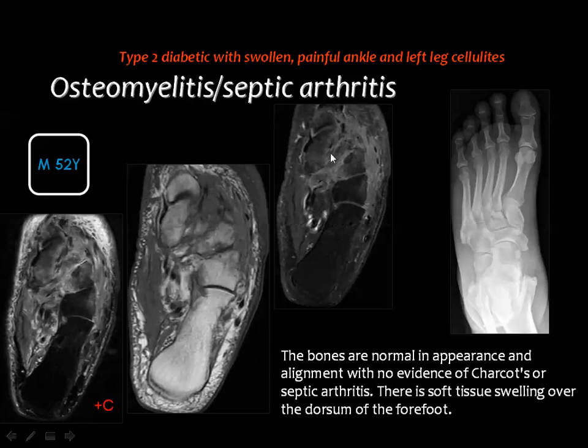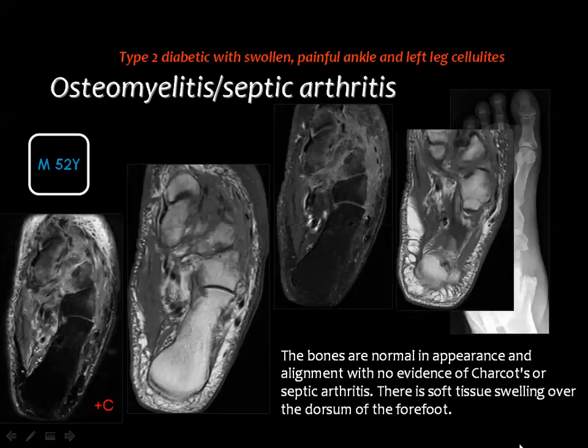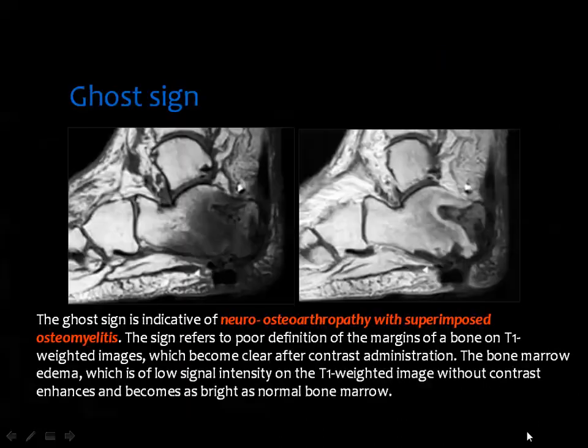This is the affected bone in the T2. If you inject, bone marrow edema of whatever etiology will enhance with contrast by MRI. And this image showed that also the third metatarsal bone is involved as well.